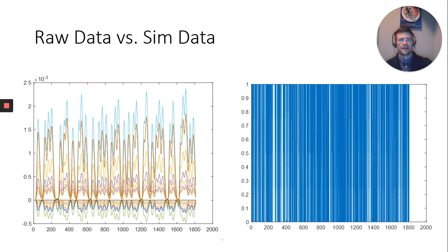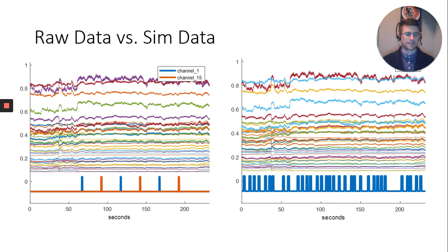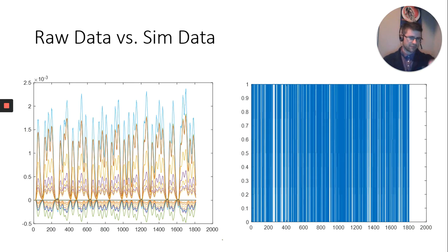based on that at set channels. The differences are shown here, so basically comparing the left data set to the right data set, this is what you get. All these vertical lines on the right in blue show each data point that is not the same. So you can see most of the data is not the same. It may not be vastly different, but it's not the same number. On the left is actually the difference between the two. So you can see over time, you actually do have modulations. They're very small. It's to the 10 to the negative 3 power, but they modulate at a set pattern almost. And this pattern is basically those basis functions added on to the stimulus. So that's what you see there.